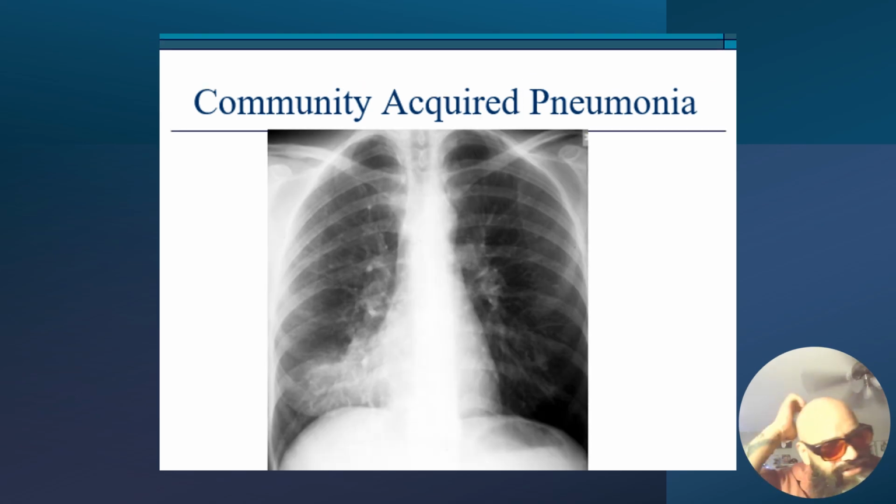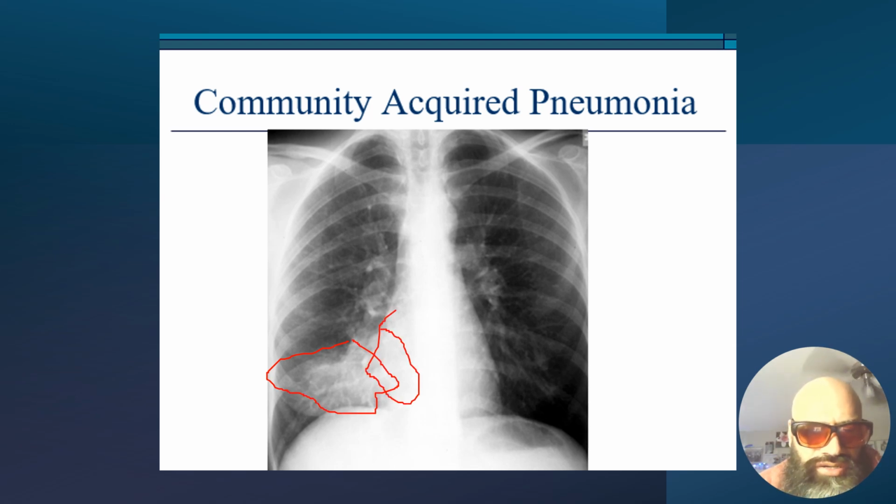Based on patient presentation as well, you'll be able to figure things out very nicely. This one is the most common area here of pneumonia, the right lower lobe. So we have some right lower lobe consolidation here. We have a loss of the right cardiac border. Remember, we have two same density regions here. The heart is filled with blood, and now in this situation, the right lower lobe is filled with fluid. So we have two same densities. Obviously, that will obliterate and obscure any borders that may be seen within there.